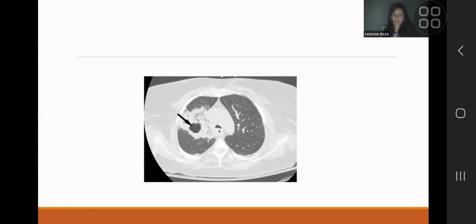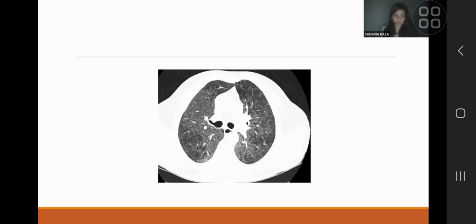In an unwell patient, this would be consolidation with secondary cavitation, or in a reasonably well ambulatory patient, it would be suspicious for cancer. This one, just tell me, describe it to me. Some of the terms you would use in this one. It could be consolidation. Use more than one.